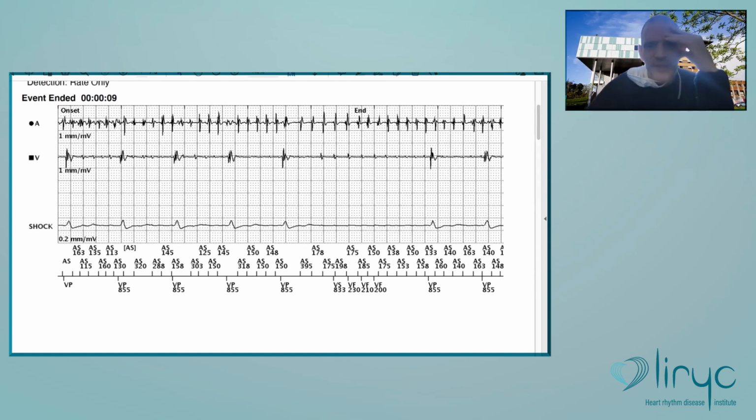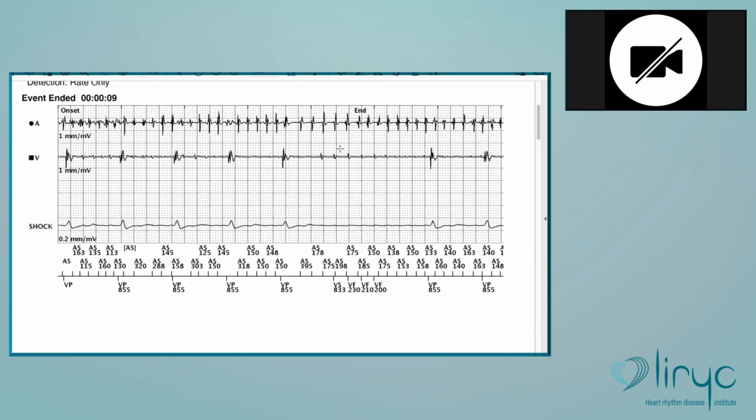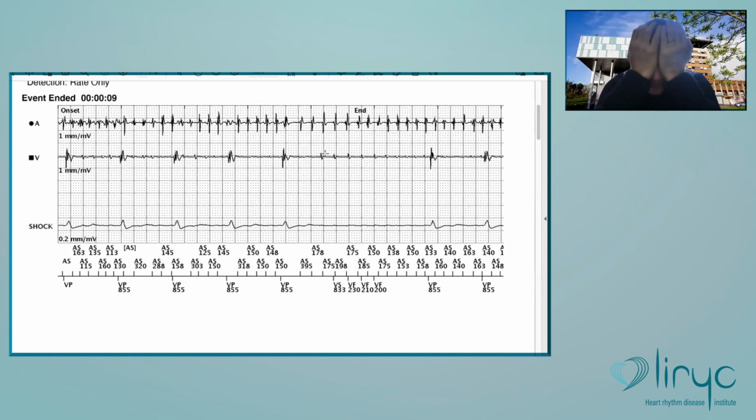So remember, if you want to illustrate the problem of P-wave oversensing, of atrial activity oversensing, most of the time it is with a Boston Scientific device because of the specificity of the lead, the pseudo-bipolar, integrated bipolar leads, which increase the risk of atrial oversensing.